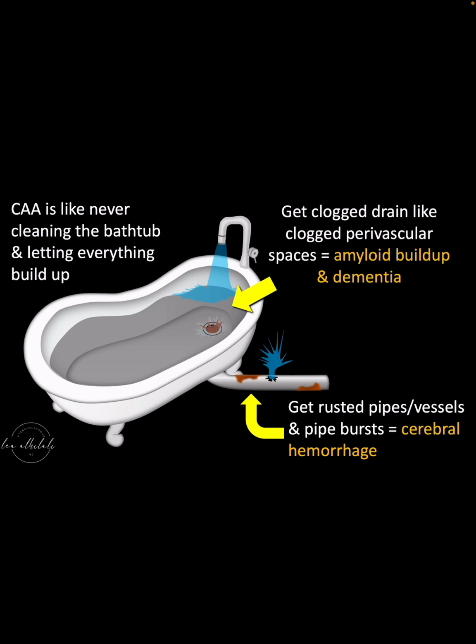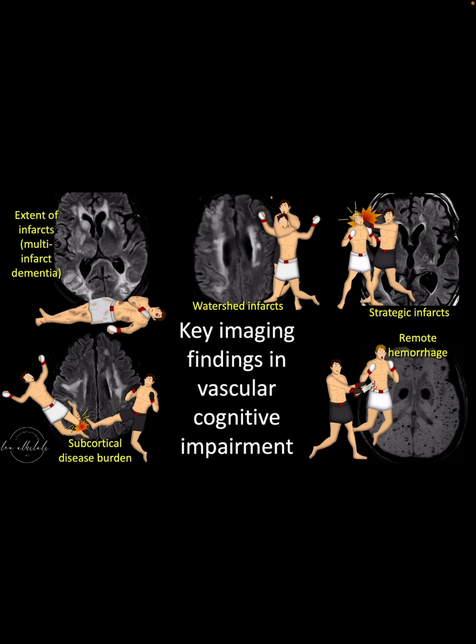So when you are reading any study for dementia, it's always important to mention any signs of hemorrhage or microhemorrhage that may indicate amyloid, because that not only contributes to the microhemorrhages, it also contributes to neuronal death and dementia. So now hopefully you know all the important signs to look for when you're reading a dementia study that may contribute to vascular dementia. So now you can make all the findings so you have a report that's a knockout punch.